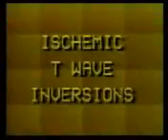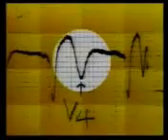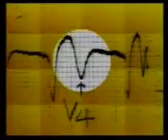Now we come to the ischemic T wave inversions. The T wave of myocardial ischemia is very typical. A normal T wave has asymmetrical limbs and a flat top, but in ischemia it becomes symmetrical and pointed like an arrowhead. First we will consider a patient who is in acute chest pain.